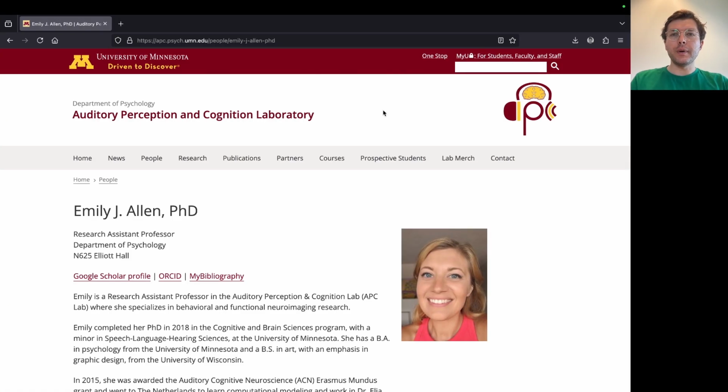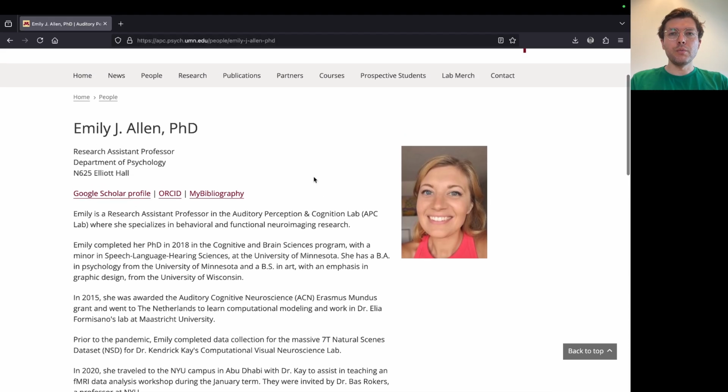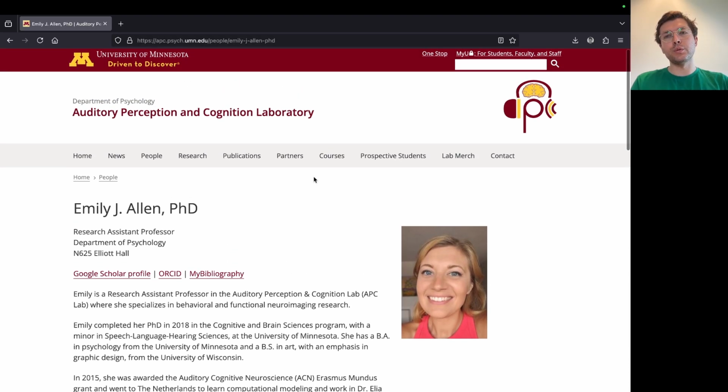So this video is made for my colleague and collaborator Emily Allen, who is a research assistant professor at the University of Minnesota, Department of Psychology, Auditory Perception and Cognition Laboratory. We are running a project together with Emily, which is looking at the details of the auditory cortex in living humans. Therefore we recorded some data, and now we are moving to the analysis stage. So this is a video to show Emily one of the important steps in our analysis.